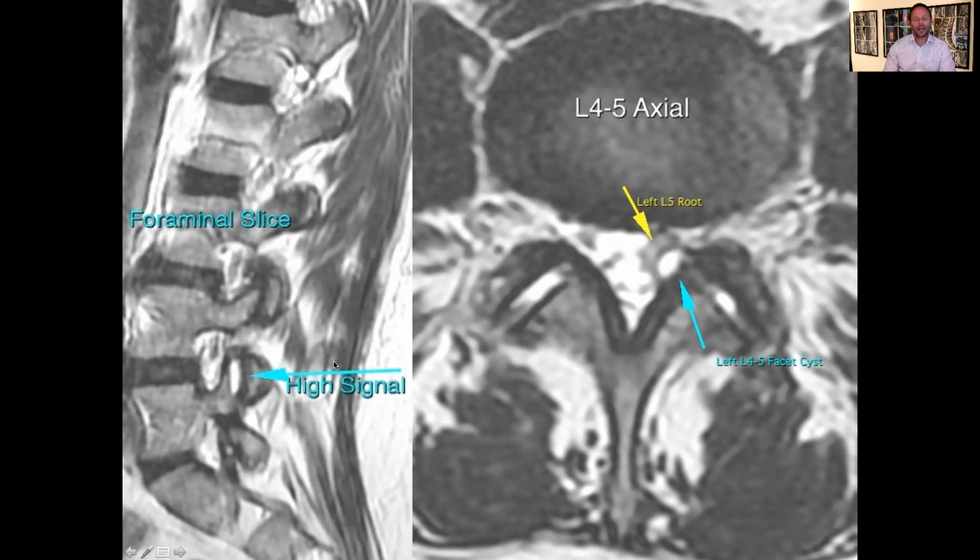I sent her for a scan, and I must admit, on clinical examination, I equally would have thought that based on her symptoms and sciatica, it was likely that there was a pinched nerve, most likely to do with a disc. But here you can see why it is so important. She'd suffered for 6 months, by the way.